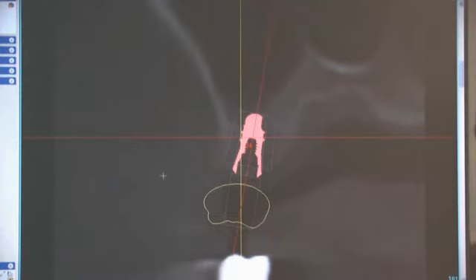Sure. Okay. Very good. Then now we're on to number 14. So you can see here, let's go ahead and hide the implant for a moment, just to show you. Here is your height of bone, and then it looks like you've got a thickened membrane. Can you measure that, Brett? Can you measure it from the crest to the? Absolutely. So the crest is about there, and that's about to the floor of your sinus.